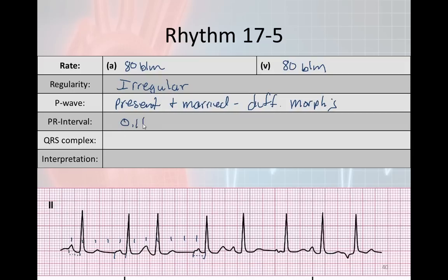So the QRS complex looks almost a little bit wide. So we're going to say 0.12 second. I really wish I had some calipers to do this. It would make it a lot easier. This is kind of hard for the QRS because, as you can see, it's scooping here. So you want to use something where you can see a definitive deflection. This is the best one right here to find a definitive deflection away from the QRS complex.